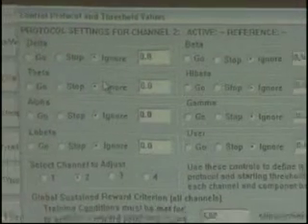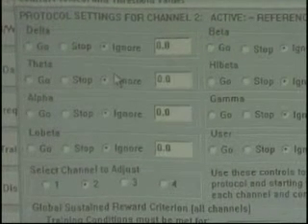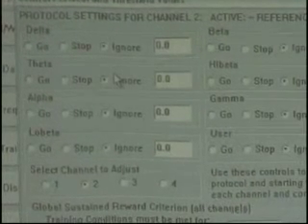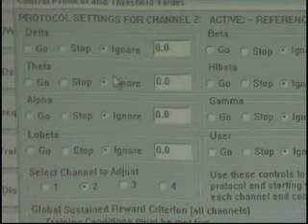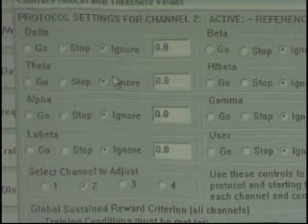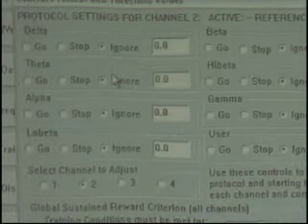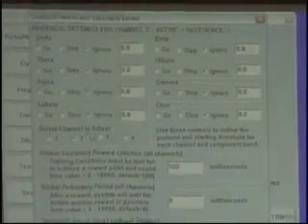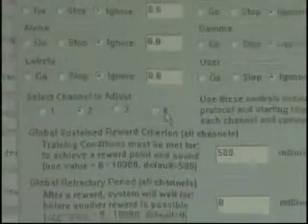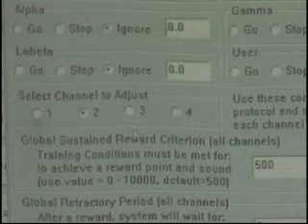But the one mistake a lot of clinicians make is they select 4 channels up at the beginning in data channels. We know we're going to do a 4-channel protocol. They forget to adjust their protocol per the other channels. Because with 4 channels, if we were doing traditional neurofeedback, you could basically have 4 different protocols, a different protocol on each channel. But you won't if you don't go through each of these panels and set them. Does that make sense? Okay.